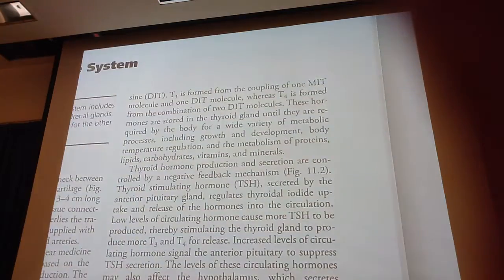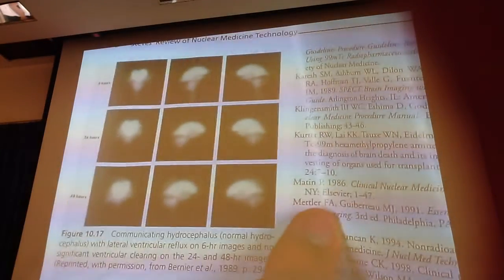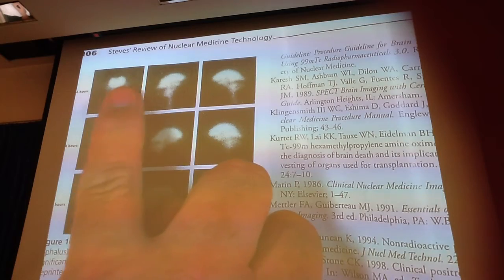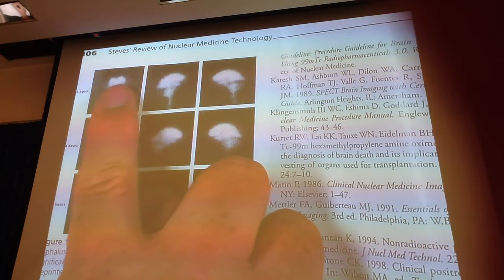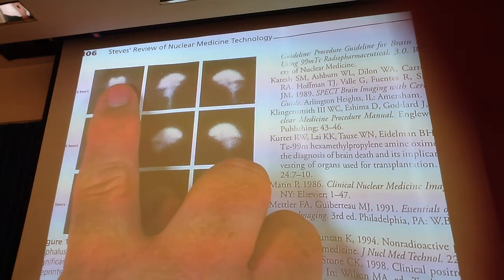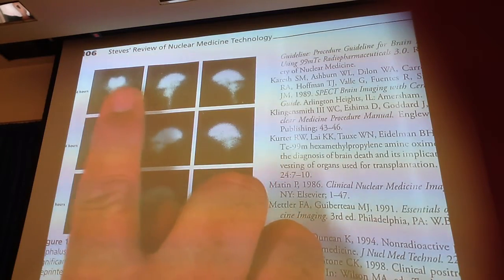But on the next page, I think there's one. What's the imaging agent for that cistern? Indium DTPA. Okay, here's an abnormal one. You don't see the pitchfork, but what you do see are the ventricles. So the pressure was so high, it pushed it back into the ventricles. So this is hydrocephalus.